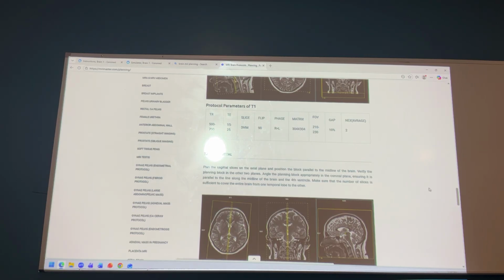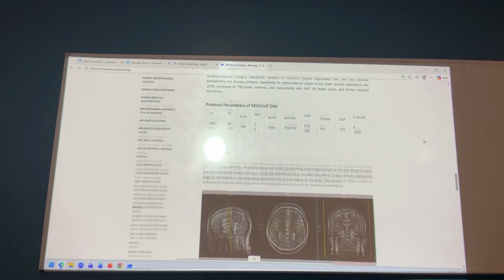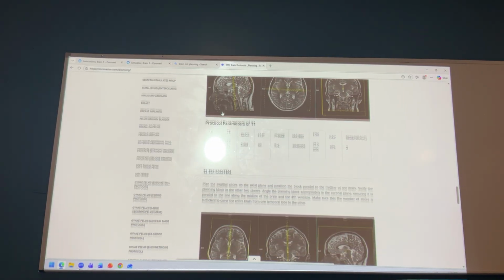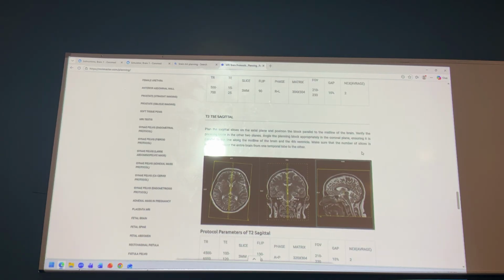Okay. So, let's get back to our workup sheet. We were at slice acquisition and alignment. Okay, so in your MRImaster.com, scroll down and find a sagittal sequence. It says coronal here, scroll again, it says sagittal. Use this one as your guide for the sagittal sequence. Doesn't matter if the rest of the stuff is not matching what you have in your course map. Just as long as it says sagittal, use this.